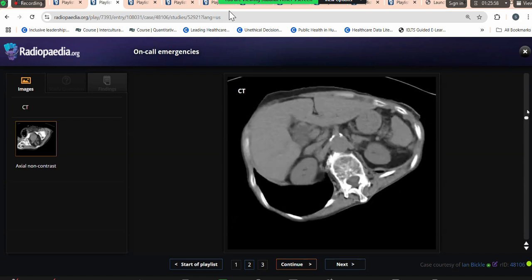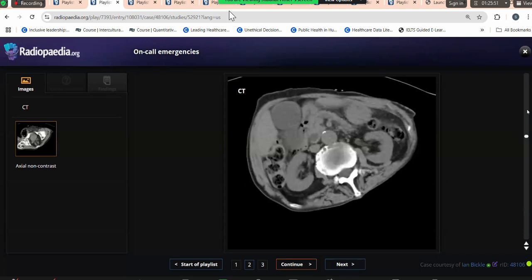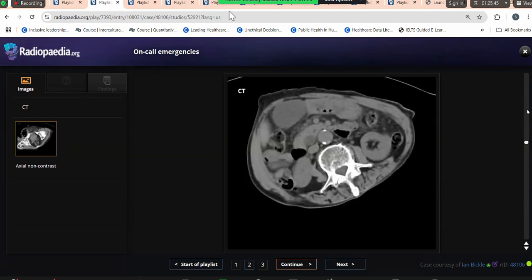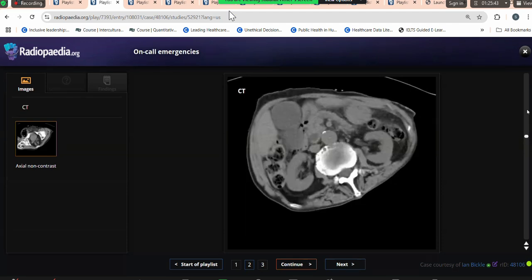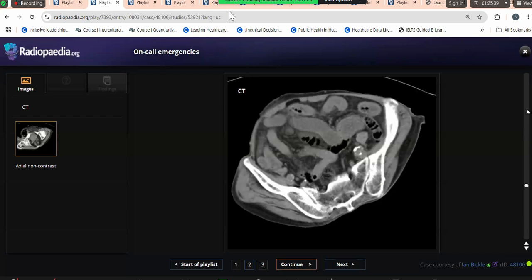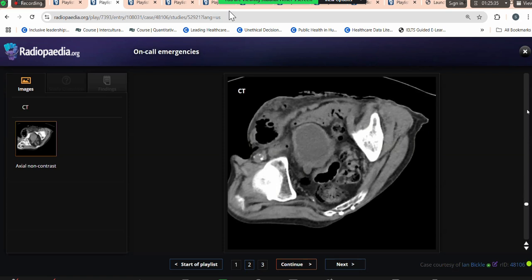Considering the patient's acute presentation, there are two possibilities: the dilated gallbladder with dilated CBD. The bowel loops appear normal. There is a calculus in the dependent part of the gallbladder. And inferiorly, the findings which I previously mentioned, I would like to reconsider those again.